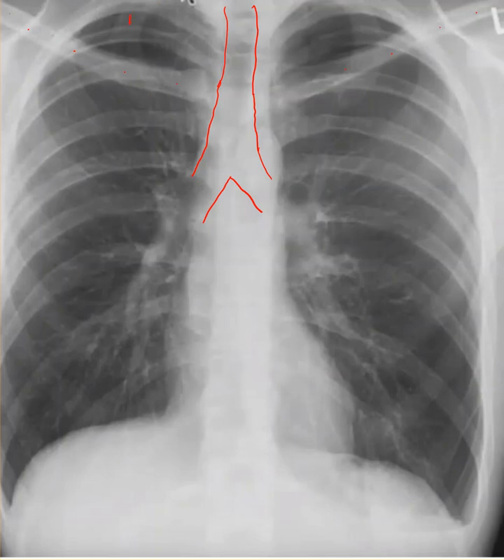That's your first rib. Second rib, third, fourth, fifth, sixth, seventh, eighth, ninth, and 10th. You see the 10th goes down into the diaphragm, and that's how it's supposed to be with a good film.